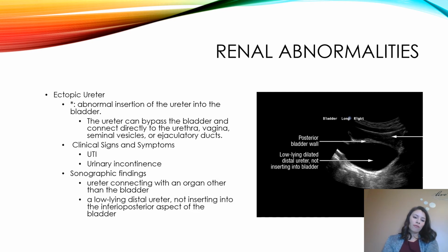The sonographic findings: the ureter connecting with an organ other than the bladder, or there's a low-lying distal ureter not inserting into the inferior posterior aspect of the bladder. So they should be connecting down here at the posterior part. And you can see that it's not posterior, it's connecting right there.